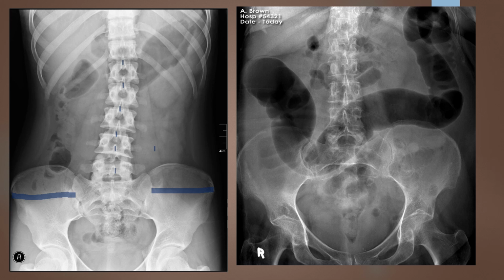And because they are really similar in size, let's see, it looks like the left one is just a little bit more enlarged than the right. That would indicate that the patient is very slightly rotated into an LPO position. So they're just very slightly rotated to the left, which if I come back up here to these iliac crests, I can kind of buy that. So certainly not repeatable, but just something I could correct if I have to repeat, or if I have to create an additional image to pick up that bladder or pick up the diaphragm.